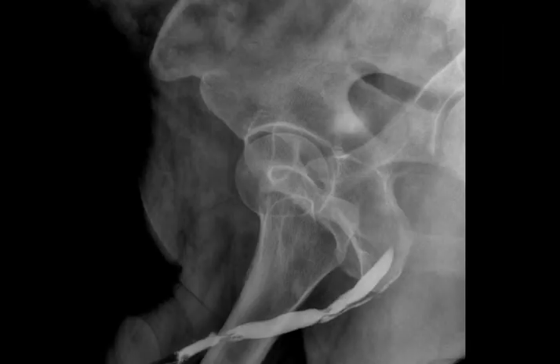Not a bad idea to have an AP view also, to see any side tracks. If there is a track or something, you take more views of the laterality of the lesion. Where does it extend? In any radiological exam, we always need to take at least 2 orthogonal views.